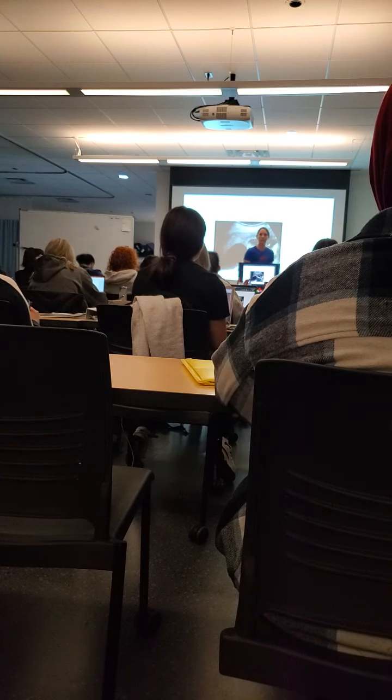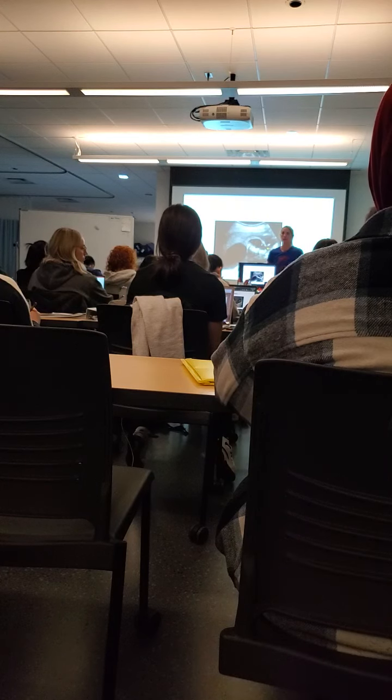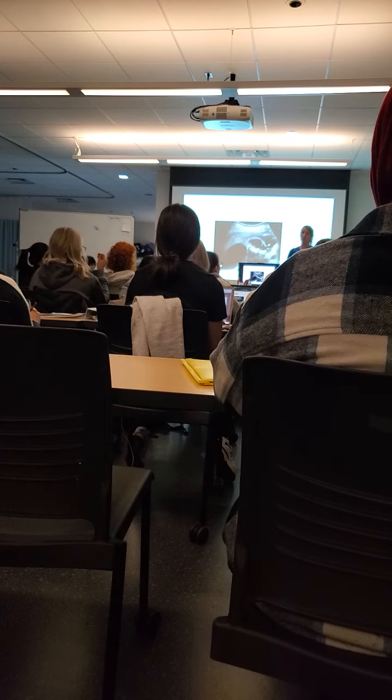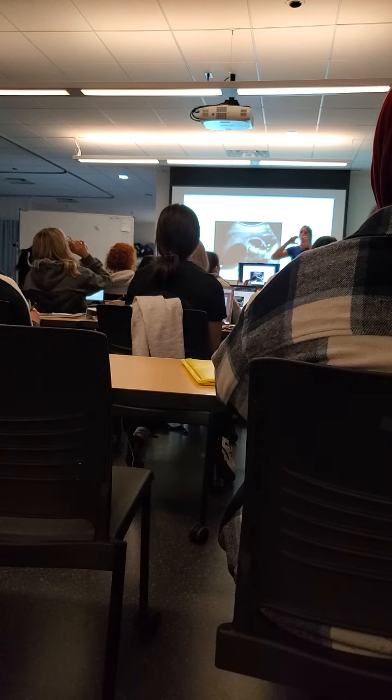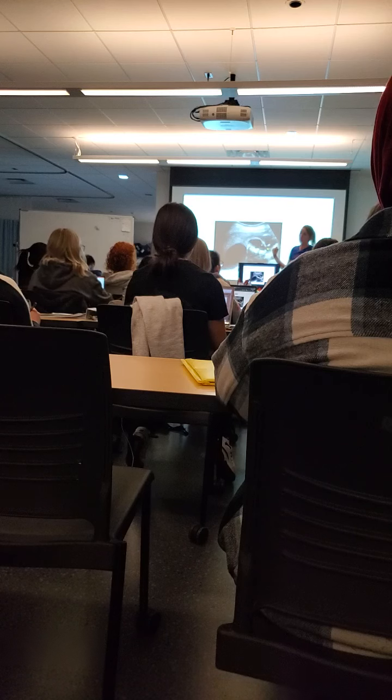How do you tell the difference between this and like the septation, like the little cap? Because your demographics are going to be much worse, right? Your patients are going to feel much worse. The Phrygian caps are normal looking, they just have a little fold in them. Nothing about this is normal.